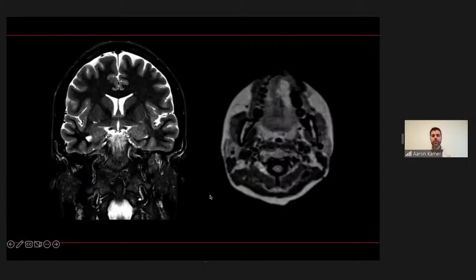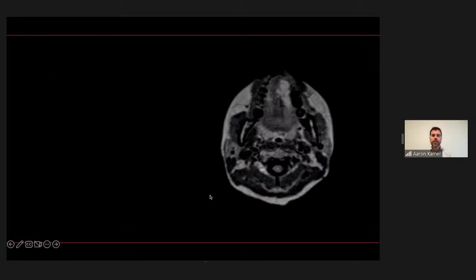All right, nicely done. Okay, so let's see. I don't know who I haven't picked on quite as much. Let's see. Jared, can you tell me what you're seeing on this FLAIR image?